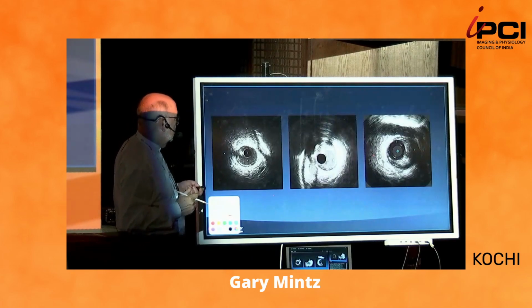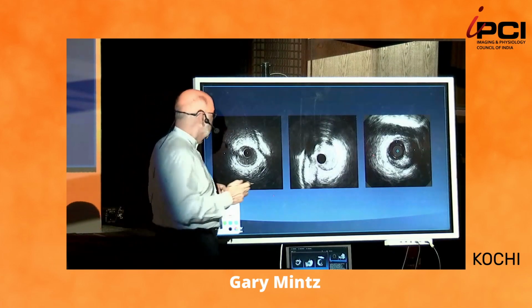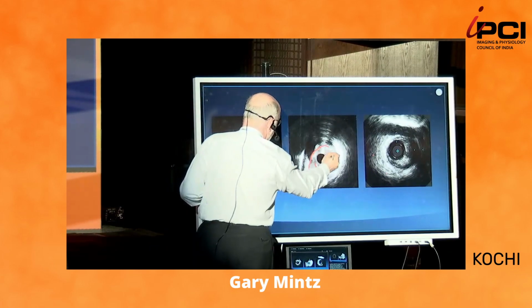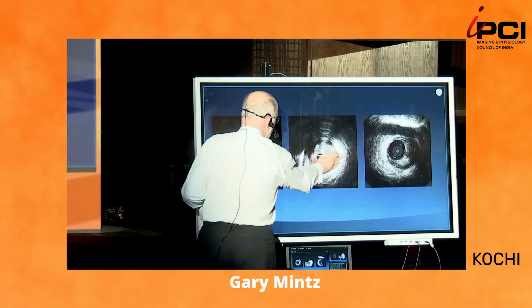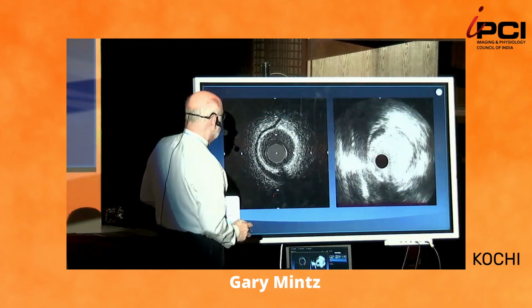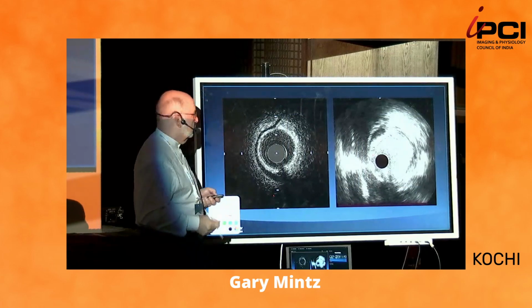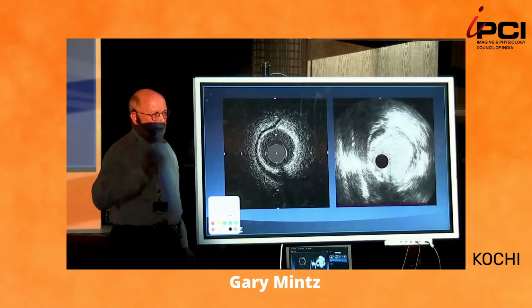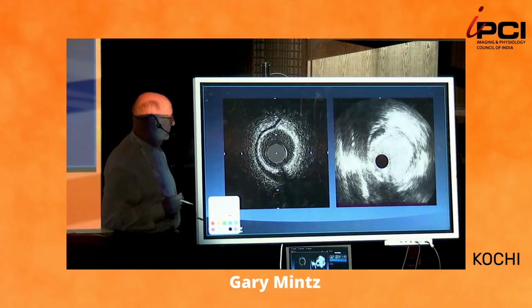Okay, so three examples of pericardium. This is an example of a side branch connecting with the main vessel. And these are muscle bridges. Now, why is a muscle bridge important? You don't want to extend a stent into the muscle bridge because the stent will fail. Okay?